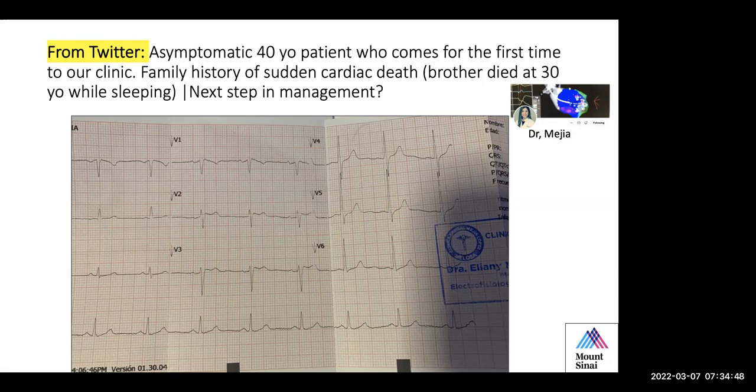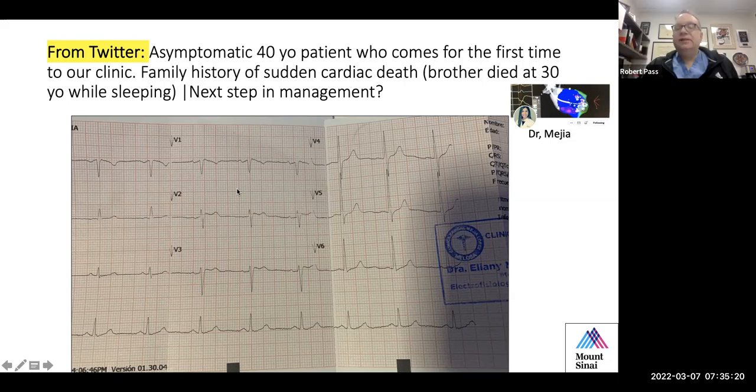It looks like it's likely a sinus rhythm. Initially when I saw the clinical vignette, I did jump to the J point and the T wave. It did in V1 look like the J point was slightly high, but not like an obvious Brugada pattern. And nothing else stands out to me in the precordials. I think I would probably do a procainamide challenge. Yeah, I think so. This actually looks like a type 1 Brugada pattern.